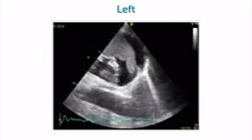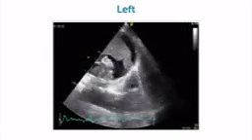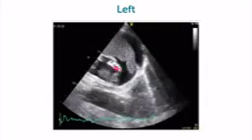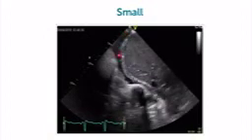Here we have the example I showed you previously with the diaphragm here. Now top is here, bottom is here, and this is the pleural effusion here, and this is the free fluid in the abdomen, the ascites. Of course, you could even detect small amounts of pleural effusion. This is the advantage of echocardiography. We're actually more sensitive than the chest X-ray is. A very small effusion right here on top of the diaphragm.